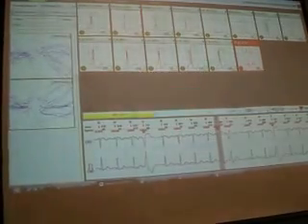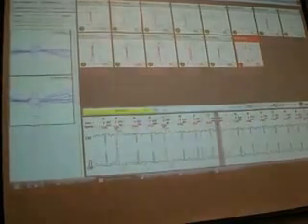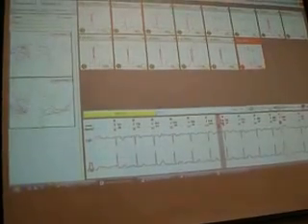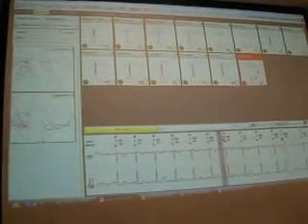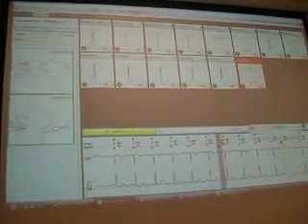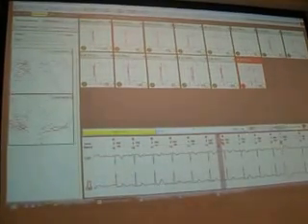And this is the last, which has some problems, and I show a new function, how to use the fix button with this cluster. Fix button means if I want to rename the cluster type, for example to noise, I can do it except for the QRS which are fixed. I will show it.